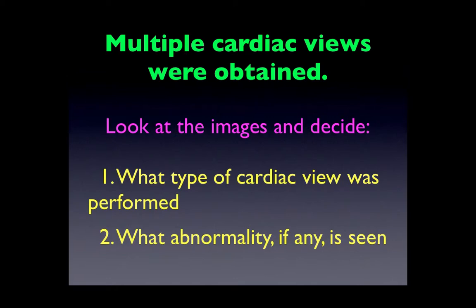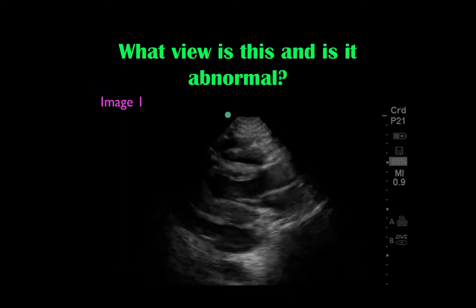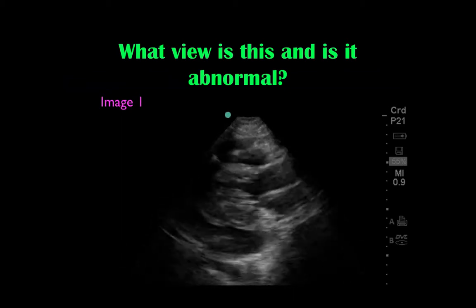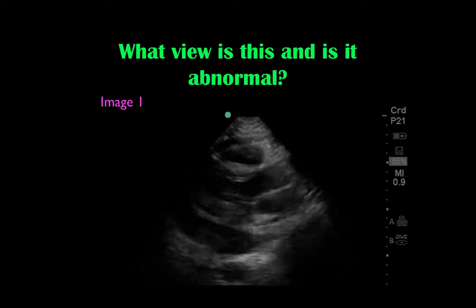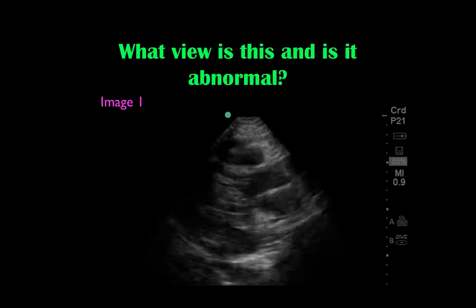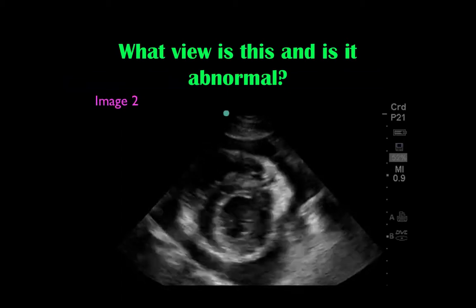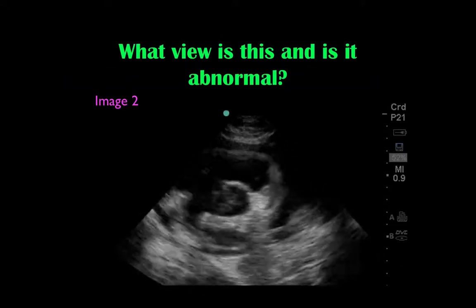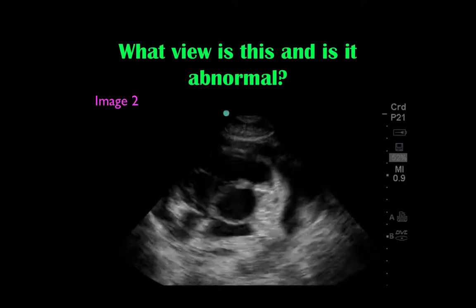So let's first look at these images and decide what type of cardiac view was performed and what abnormality, if any, was seen. This is image number 1. What view is this, and is there any abnormality? Now let's take a closer look here. Image number 2. What view is it, and any abnormality once again?